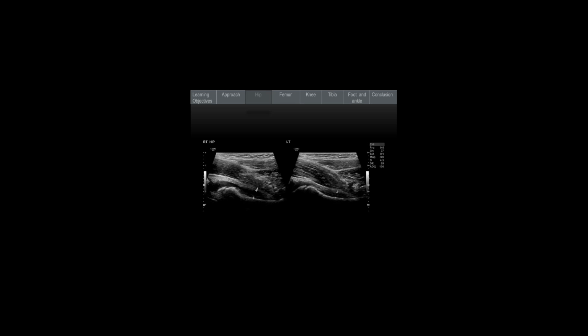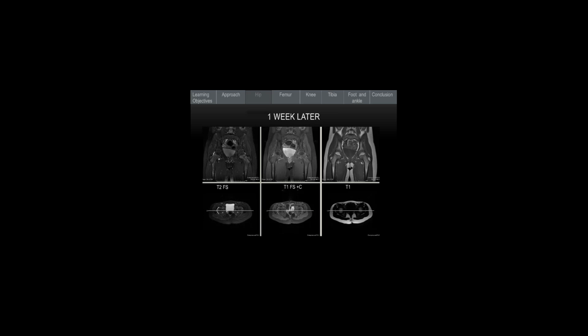So this was confusing. The child came in, had pain on the left hip, now was having pain a week or so later in the right hip. We did another MRI, and you can see a difference. And so again, this is the fluid-sensitive imaging all the way to our left, and the T1 weighted imaging all the way to the right. We can see on the fluid-sensitive imaging that there's now fluid on both hips, more now on the right side and less on the left side.